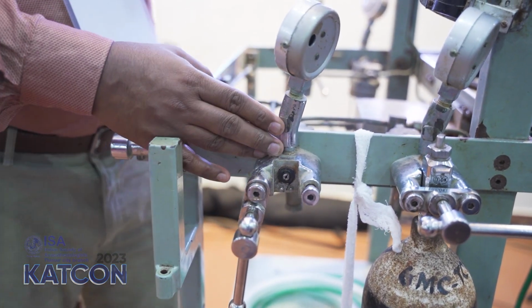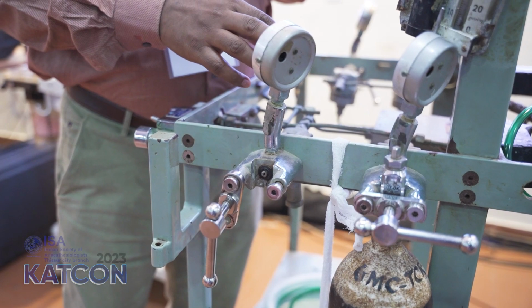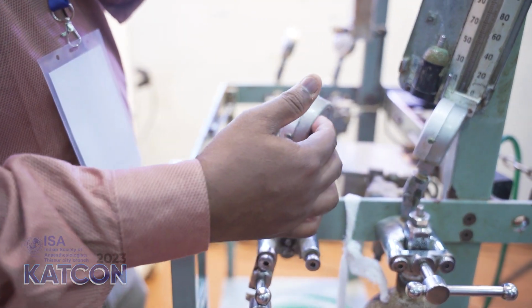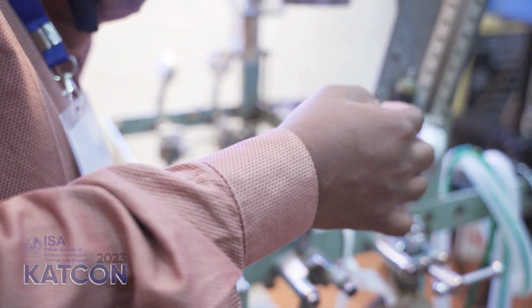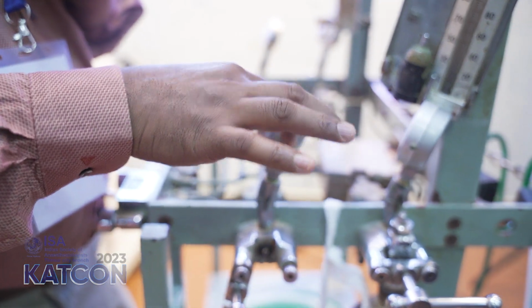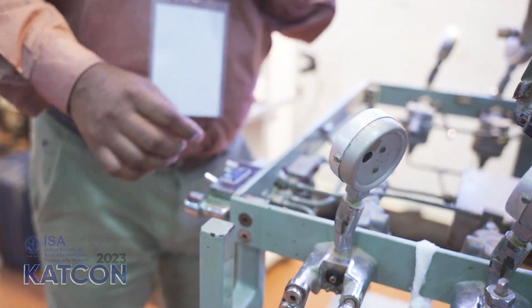Okay, so coming to this pressure gauge, this is a Bourdon type pressure gauge, which you may be all familiar with. It has safety features, including that the front side is made of thick glass, whereas the back side is made of thin covering, plus there is a rupture disc here to prevent breakage of glass during high pressure. So here it is already ruptured. It is an old machine which is not of use. You can see the place where there is a rupture disc.